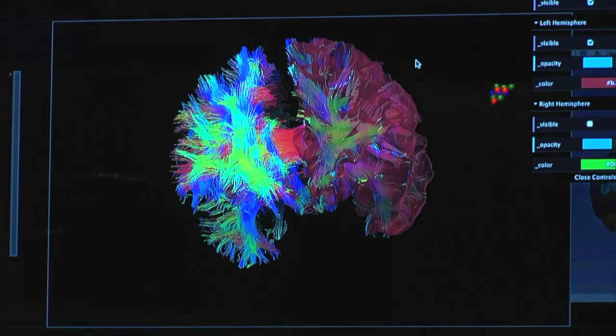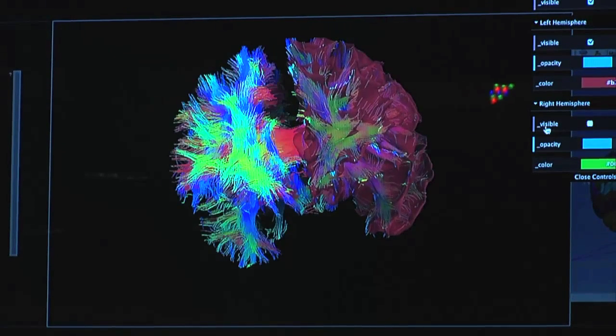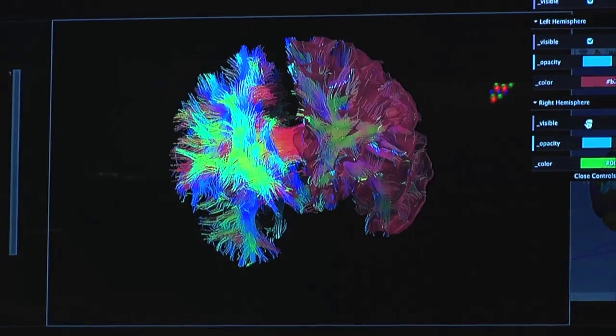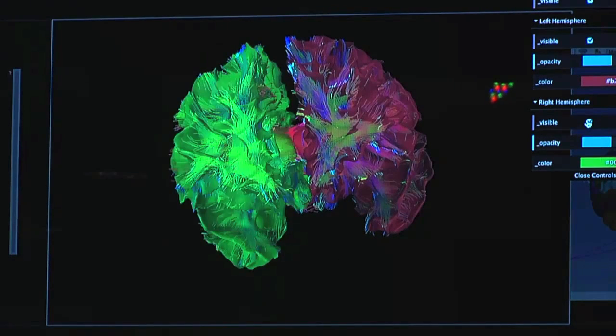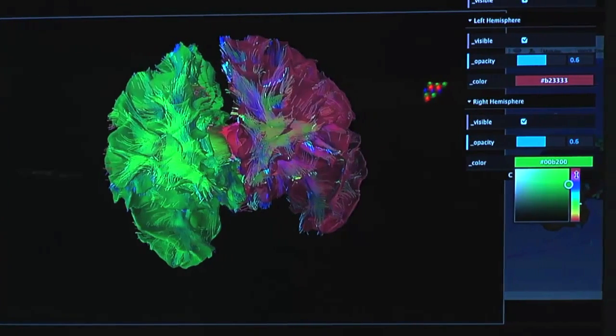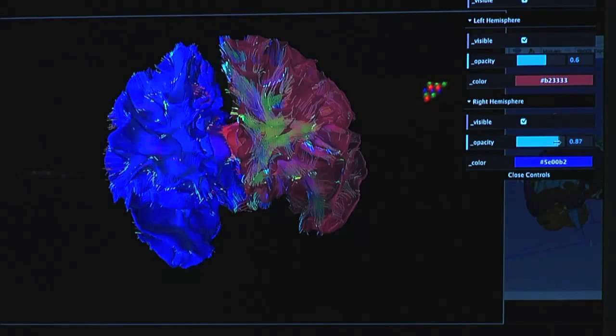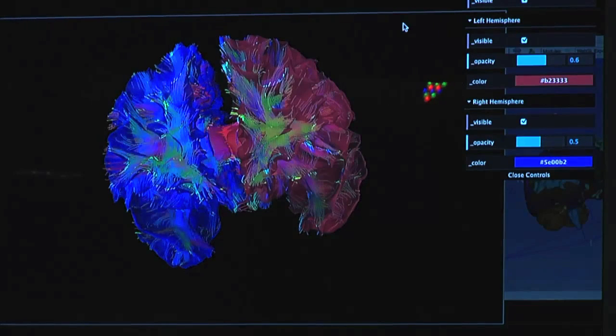It's from, I think, some Google guys, and it clips right in. So you can attach the volume and the visible attribute, and then you don't have to do anything. The checkbox gets defined, and you can change the colors, the opacity, with only a few lines of code.